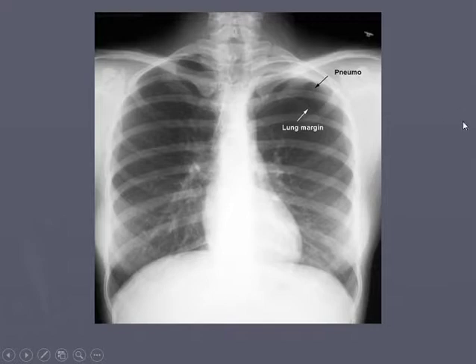So let's look at this chest x-ray again, doing your ABCDEF method. A for airway, good carina. B for bones, 1, 2, 3, 4, 5, 6, 7, 8, 9. Good on both sides. Cardiac shadow, looks fine. All right, now here's where we got the hitch in the road.